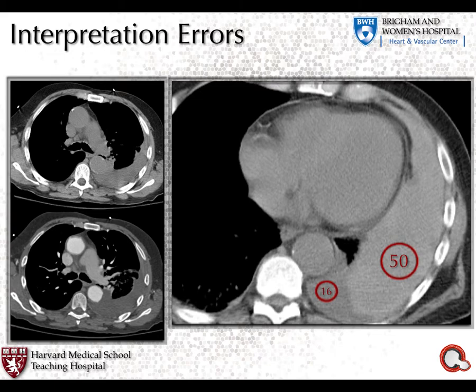So be aware, blood, particularly because it clots, can get hung up in different parts of the chest wall, right? It's not going to flow all the way down and layer perfectly smooth. It can clot up at the top of the lung, and that's the apical cap that we can see. This is just a massive version of the apical cap, where most of the blood is at the top and it hasn't clotted at the bottom.